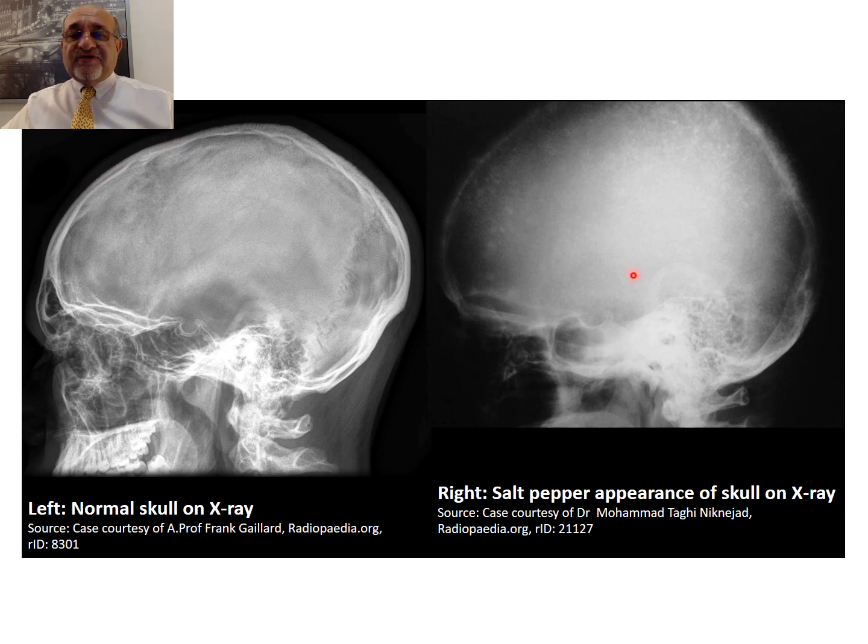Compare it to a patient who has hyperparathyroidism. First of all, the general architecture of bone is changed. The normal bone, heavy, dense bone, will be replaced by a ground glass appearance bone due to the destruction of the bone trabeculae and the bone marrow and the replacement by granulation tissue.